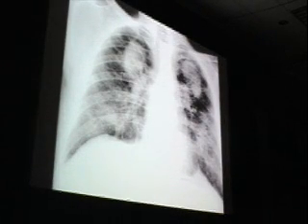One variant to keep in mind, it's very striking, and you should always recognize it if you see it, of the pneumoconiosis and coal workers' silicosis, are these progressive massive fibrotic areas, progressive massive fibrosis, conglomerate disease, generally in the upper lung zones. They tend to contract together so that distal to them you will see changes that look like emphysema with linear stranding as shown in this case. So this is basically silicosis with progressive massive fibrosis. You should remember, whenever you see sort of kidneys in the chest in the upper lung zone, think silicosis, progressive massive fibrosis.